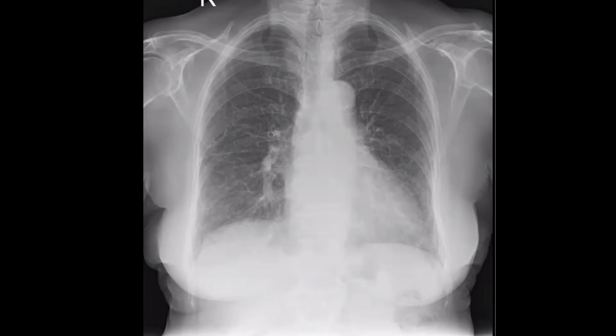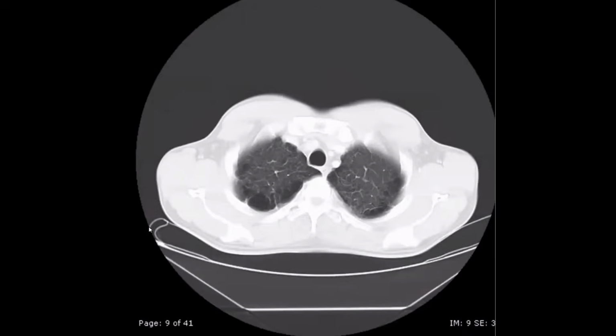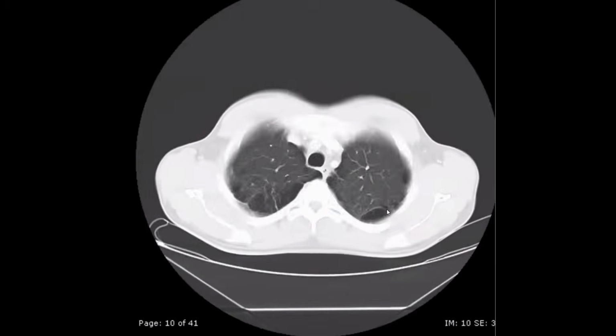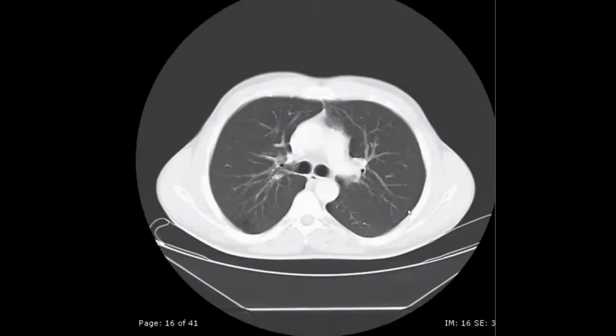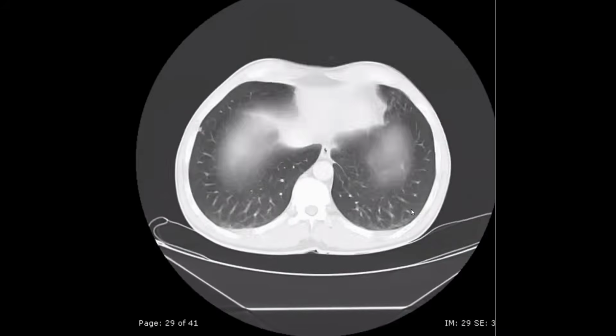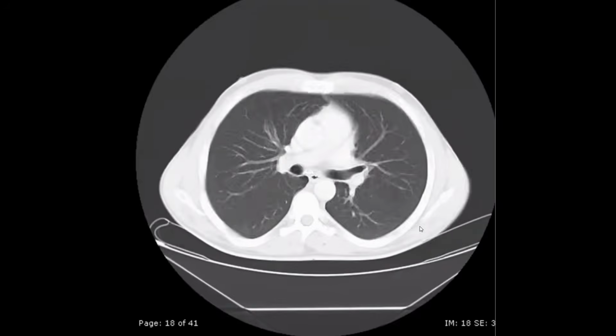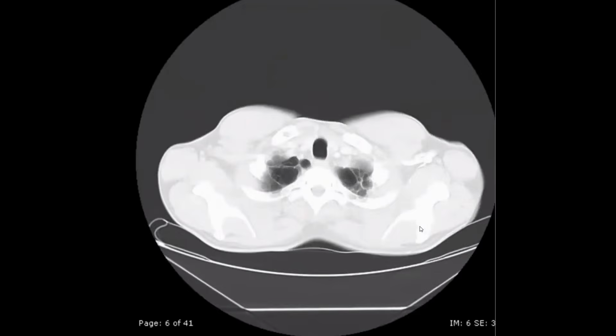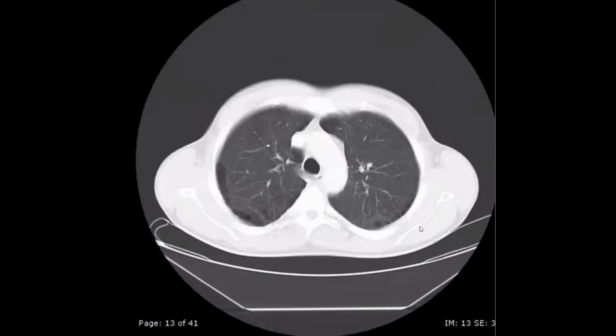Can we shift to the next case, please? Next candidate. Yes, Dr. Hyde. Candidate 9. How are you? Yeah, all good, Doctor. How are you? Let's start with a simple case for you. I will scroll it for you. Do you have any idea what this is?